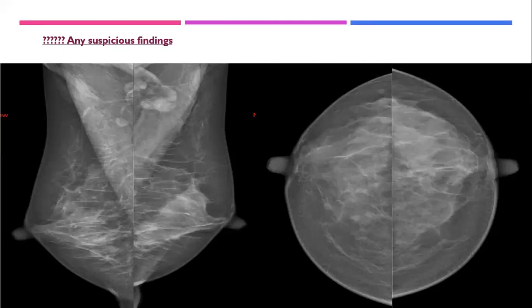This is a really interesting case. I like this case. We learn a lot from this case, but try to be a little bit quicker. You can say positive or negative. Who said it is positive? Raise your hand.